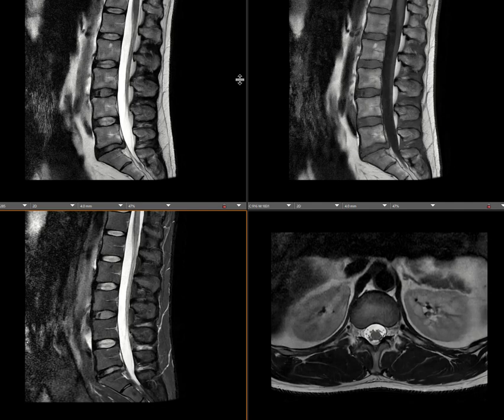Today I want to walk you guys through a lumbar spine MRI, which is a very common exam that is going to be ordered through the ER as an inpatient or post-surgical or even outpatient. It's a very common exam that is just going to get ordered for back pain, which is a very common problem nowadays, specifically in people aged 40 and above.